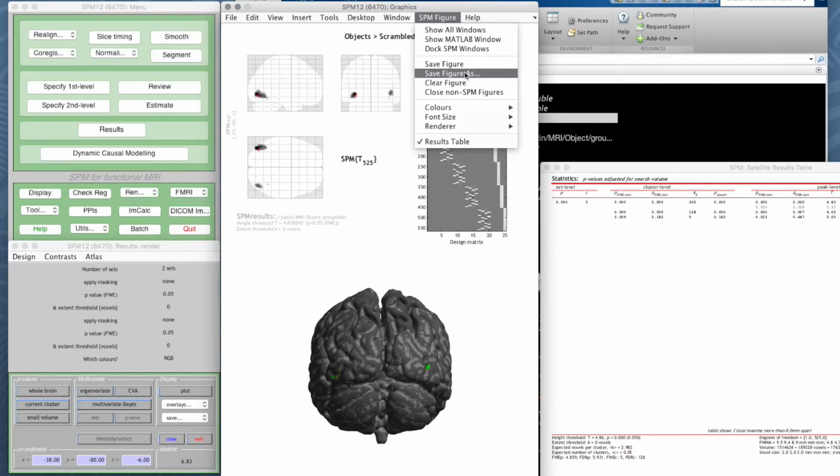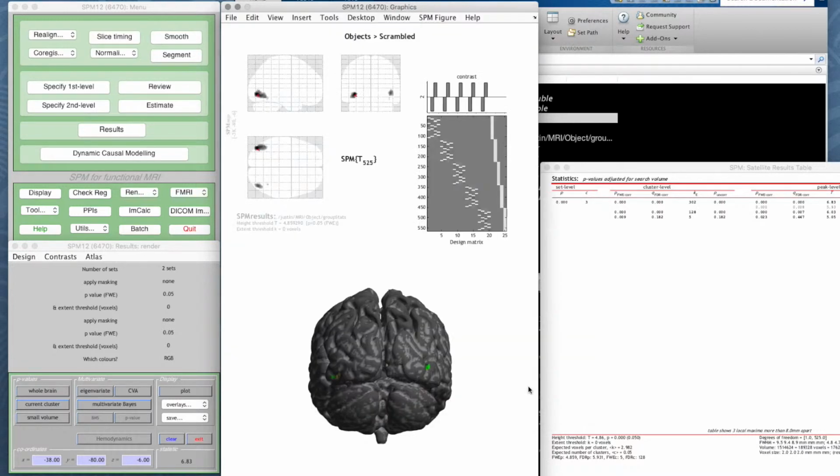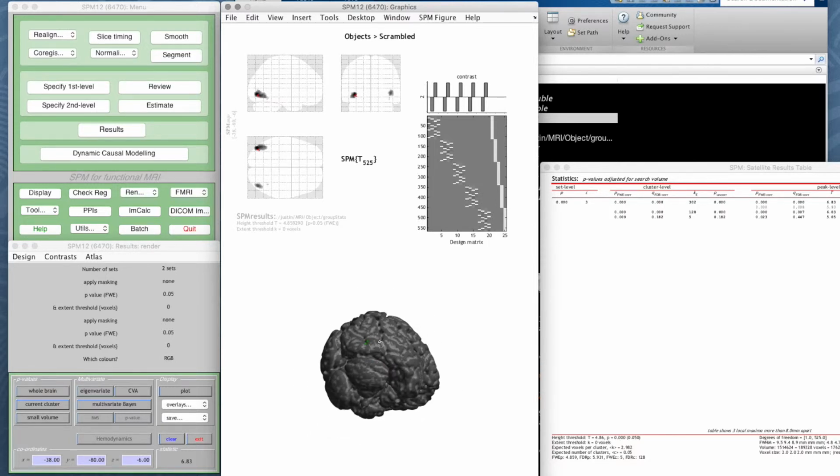can save the figure as, and you could save it in any one of a number of formats, or a PDF, or just as an image, say a PNG for example, and then you can just put that into a Word document or whatever you need to use. This isn't a beautiful way of doing it for this data because it's difficult to see what's going on there.